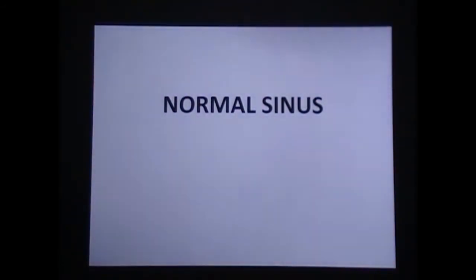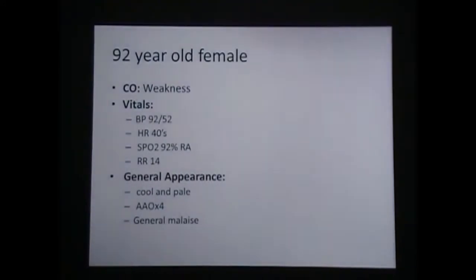Okay, come on up. Here's your next one. This is your patient. Go to town. So here's the laser pointer. Laser pointer, and then once you just click to go, actually I'll click between the slides.